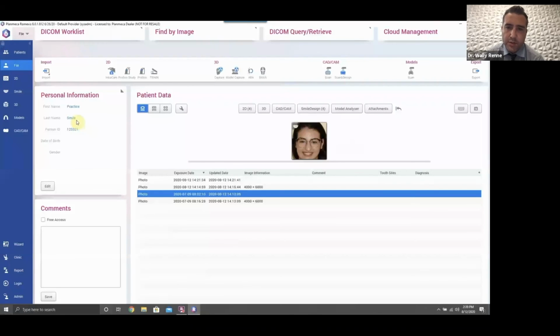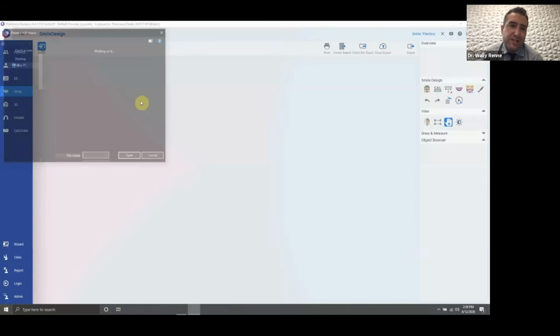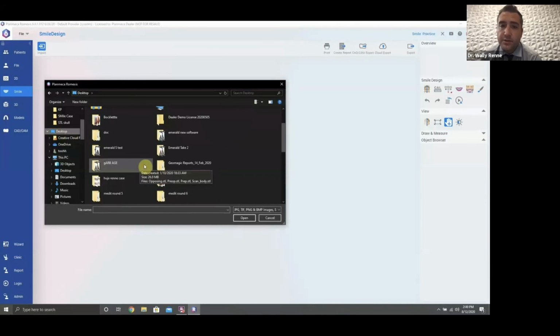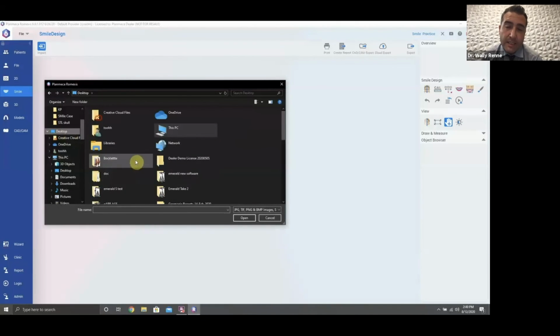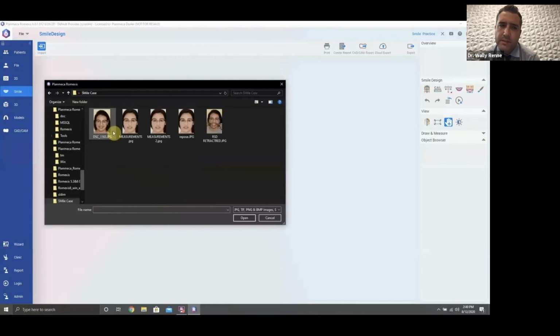And so now I'm going to show you how to do it. We're going to go through this software probably at a greater detail than you would ever want to know. I'm going to load up a patient, and we're just going to go to town. This would be as if the patient's coming to you for a consultation. You're going to take 3 photographs: repose, smile, high E smile, and retracted smile, with retractors. And we're going to show you what to do with these photographs and how we use them to diagnose the patient. So here we go.